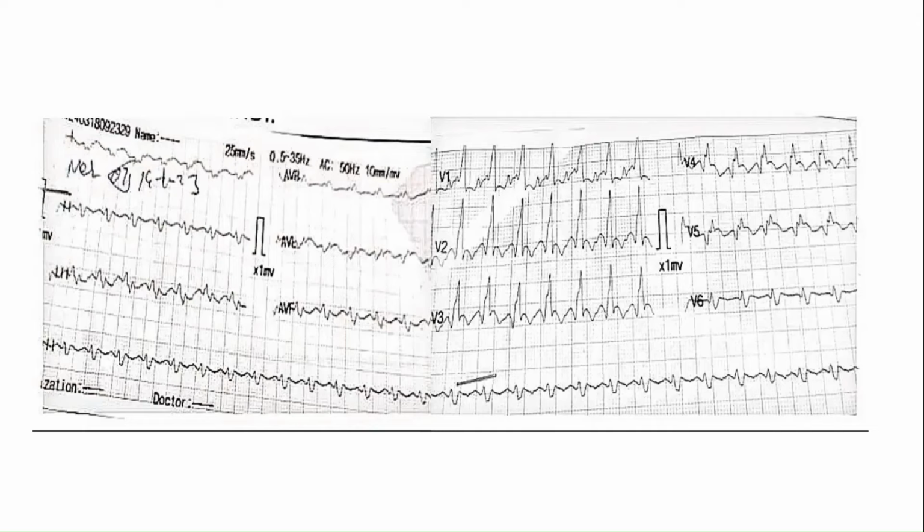And the morphological feature: in the presence of RBBB, the left ear will be bigger than the right ear. So can you see the ears? I don't know, sir, because there are two deflections up there. Is this really true? Good, very good approach. You approached the case rightly, so I appreciate that. But this is when things get interesting. All the features favor VT, but very rightly, very good of you to pick up.